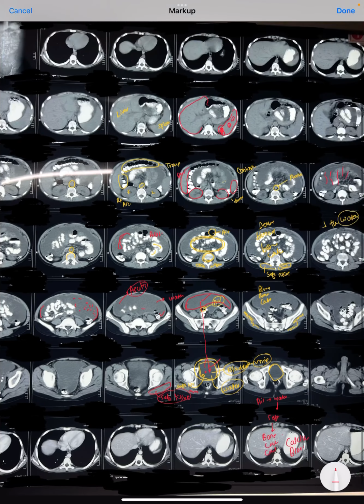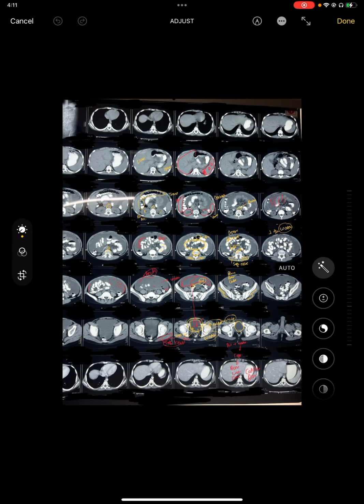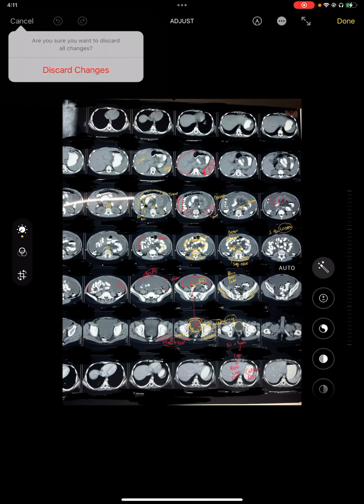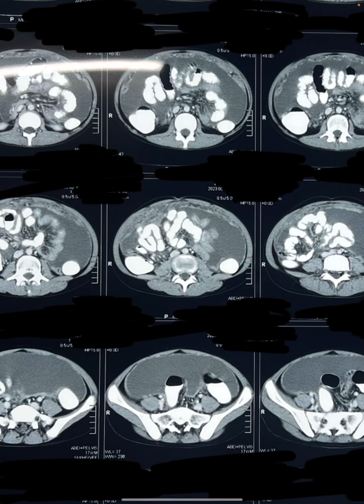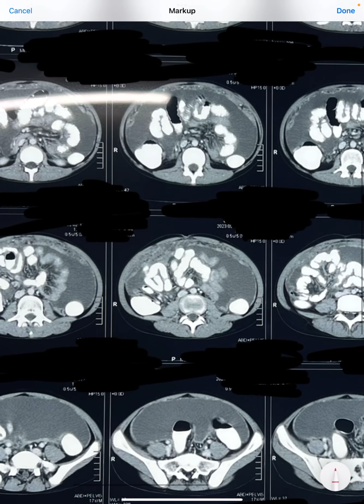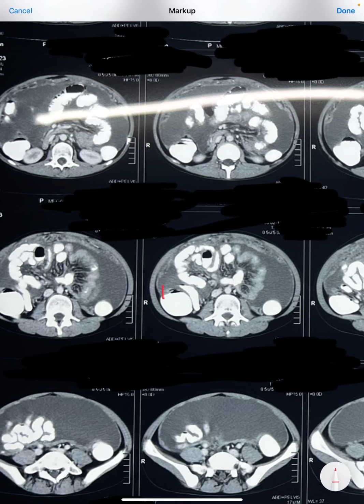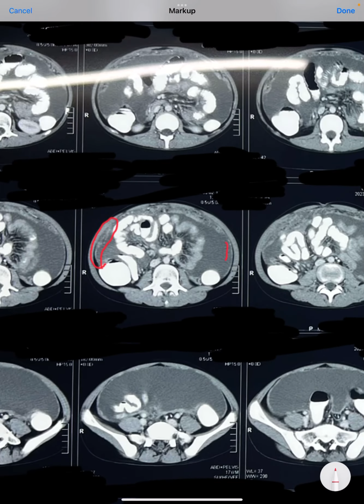There is no contrast in the blood vessel, but there is contrast in the small intestine. When we did the contrast imaging of the same patient, you can simply try to see what the finding is in this particular image. Earlier, the margins of this peritoneum were not that appreciable, but in this one, look at the peritoneum. It appears so white. In the earlier image, that whiteness was not there.